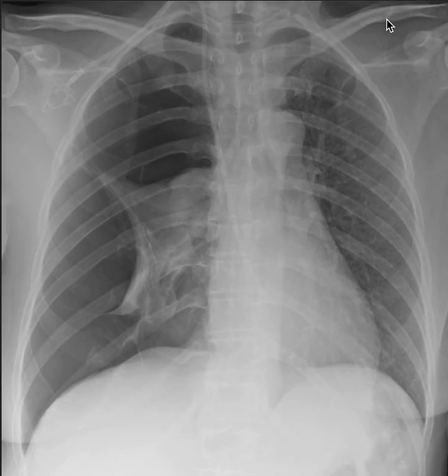All right, we have clavicle here. This flat bone is the scapula. You see the posterior aspect of the ribs that come all the way down here. This is the aortic knob, the lateral border of the heart, the left hemidiaphragm, and this line here is the breast shadow. Notice there are lung markings that go all the way out.